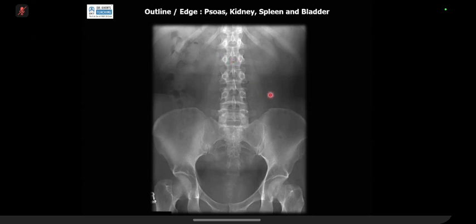Eagle-eyed people among you, potential radiologists, if you want to change your specialty, has anybody picked up a bladder here? Can you see the bladder? Yes. So, madam, consider radiology. Okay. So if you see here, this bladder is slightly full of urine, and that is why you can see this outline. Don't go home with the idea that every bladder will be visible, but it can be visible.